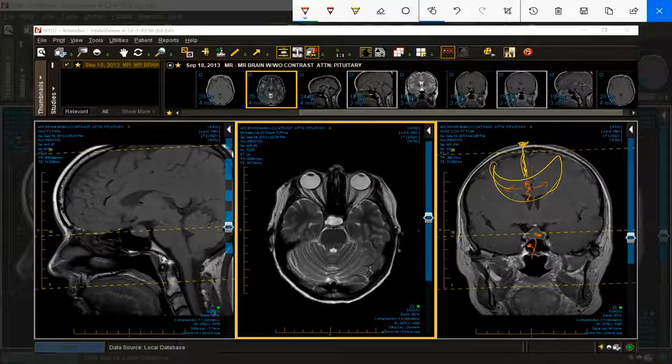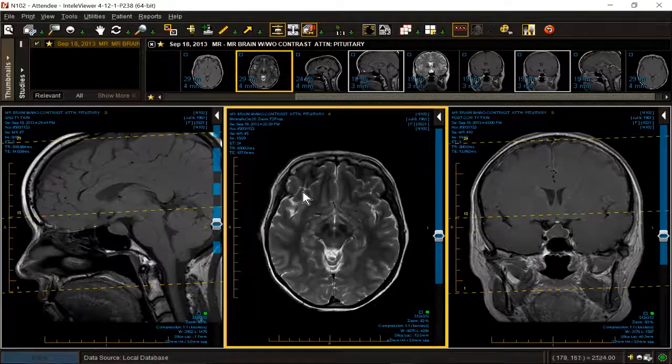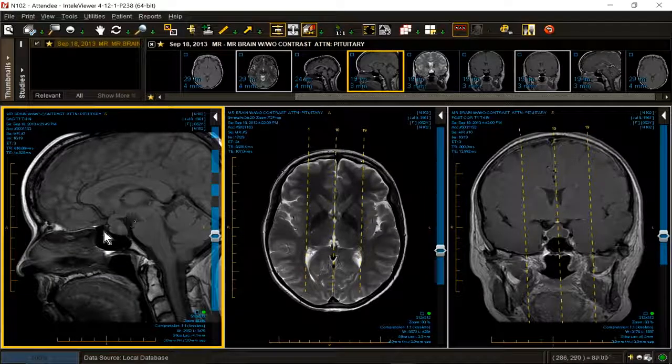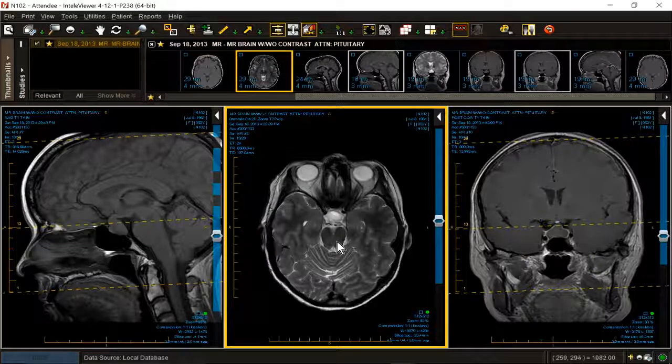All right. So now let's talk about the case. It's a rather large lesion in the sagittal projection. It has intrasellar involvement, but I didn't say pituitary involvement, I said intrasellar. It has suprasellar involvement. It's more or less intermediate, similar to the surrounding brain background. Let's go to the axial T2. It is bright, but they're not all bright.